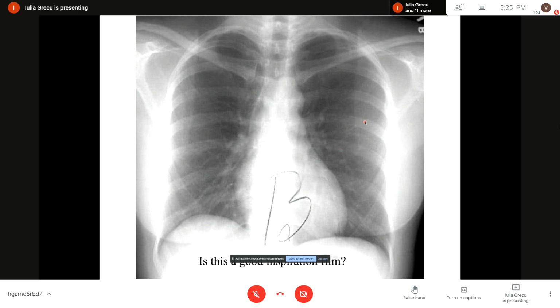If this doesn't happen, then we will have images of partially collapsed areas of the lungs or improperly distended, and they will create the false impression that maybe something is wrong with the respective parenchyma.